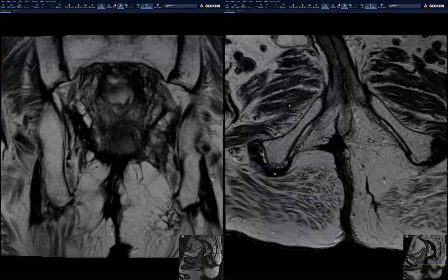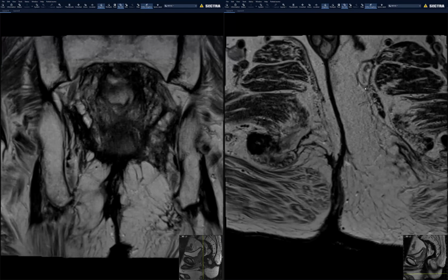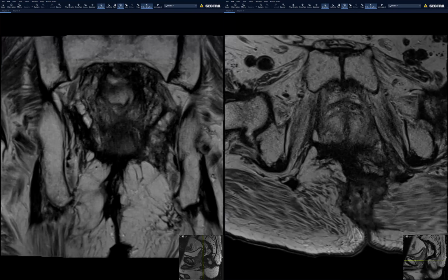We just incidentally saw it and wondered what it was, but it looked very much like the testes. You can trace all the vessels, same on the right side. That's cool. It's like the ovarian transposition that they do, when they hitch the ovaries up along the lateral abdominal wall, something similar for the testes. Just something I hadn't seen, so I thought it would be a cool one to show.